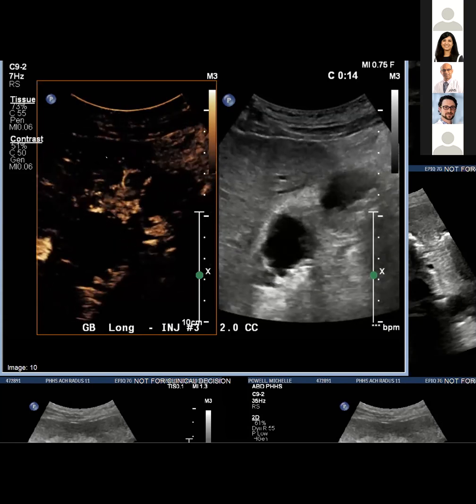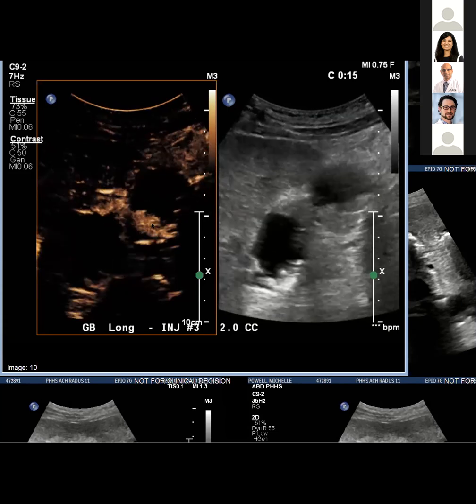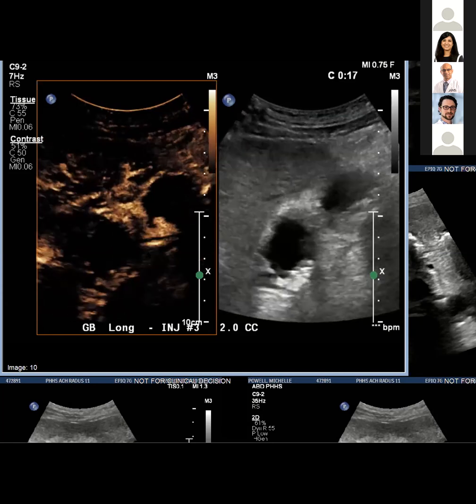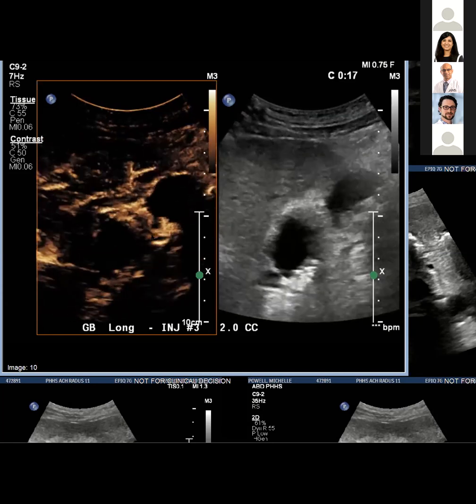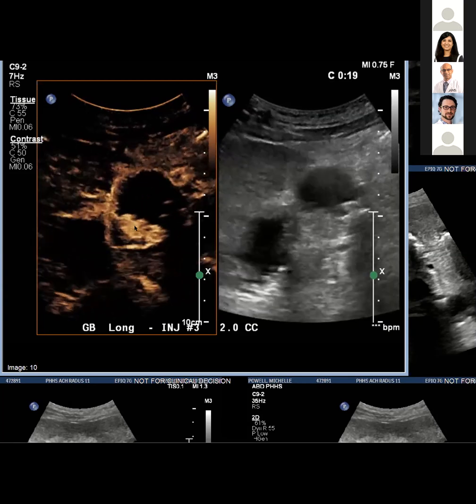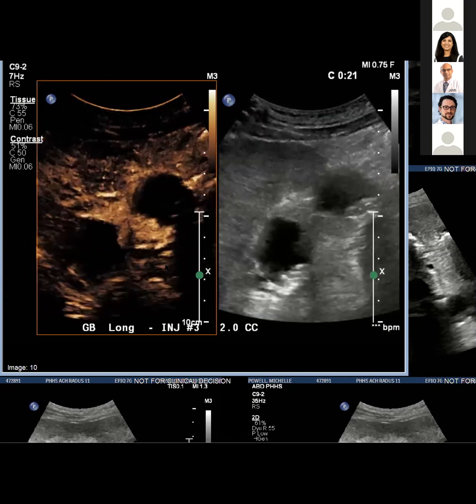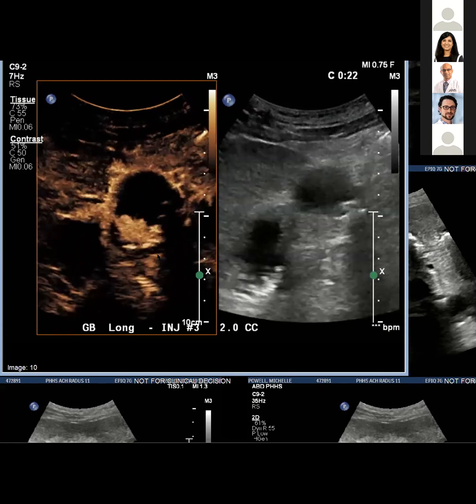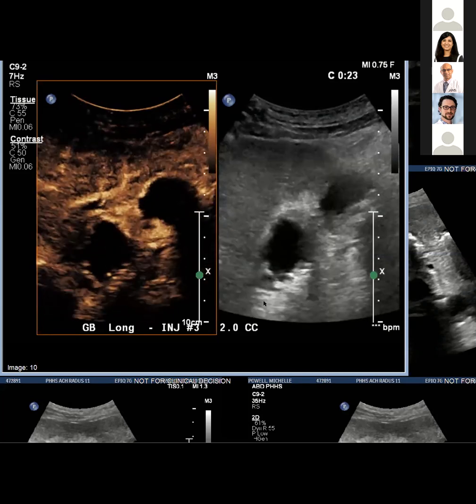some arteries fill in, the cystic artery and then the hepatic arteries. And then here you see that florid enhancement of this polypoid looking lesion along that narrowing, that wasting of the gallbladder. So all this irregular thickened soft tissue and this polypoid mass. Wow, that's so nice. I'm on the phone with surgical oncology right now, telling him, don't let general surgery take this patient. But it also shows the degree of tumor that's inside the lumen as well.